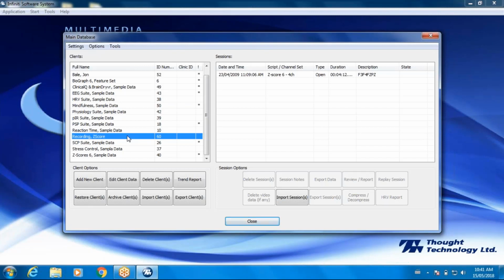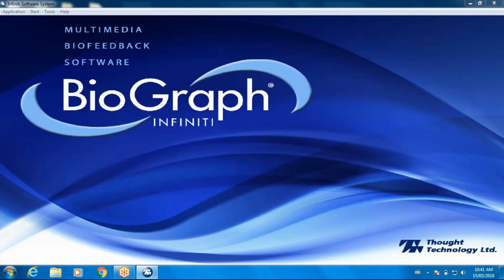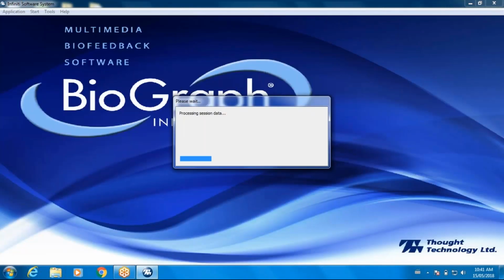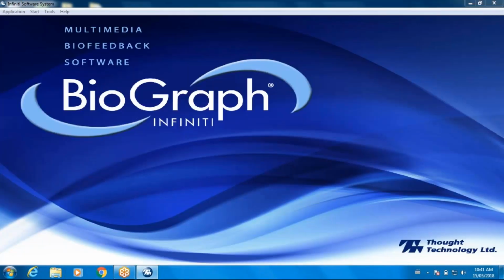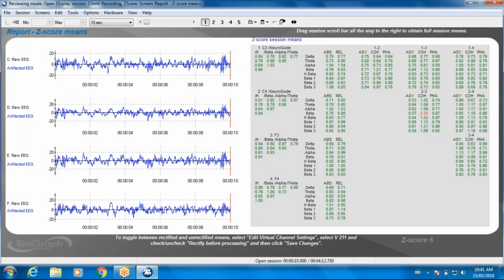So I contacted a colleague of mine, and she was kind enough to share one of her evaluations with me from one of her clients. So let's go ahead and select this session, and let's review it and have a look at that data. This particular session is recorded using the 4 channels evaluation from the Z-Score suite. That means there are 4 different EEG sensors being used, and there are 4 active electrode sites on top of the head. In this example, the sites would be C3, C4, F3, and F4.